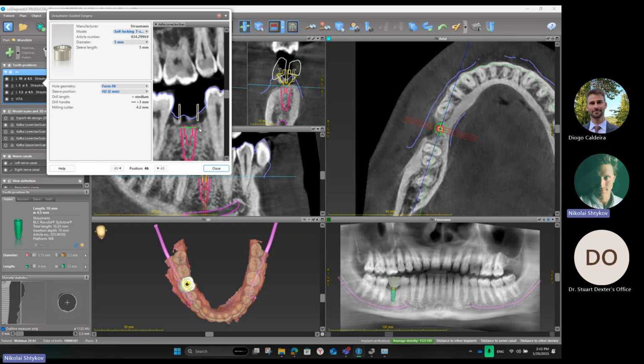Here it still doesn't intersect the teeth, and the bone also, because the implant is not too deep, but it intersects the soft tissue. And with the soft tissue, if you open the flap, yes, it could be okay, but you will not have plastic above this line. And there is less plastic. And maybe it's better to do it like this.